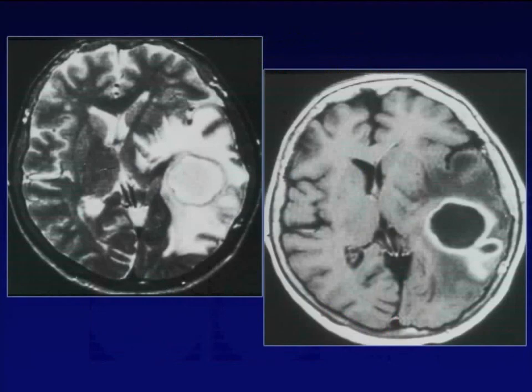And also, the last is brain abscesses. Sometimes they produce images with vasogenic edema, as you see here, and this is very characteristic for those who know that the capsule is very dark on T2 weighted image, dealing with an abscess, and it's thinner on the inner side. And this is the daughter abscess.